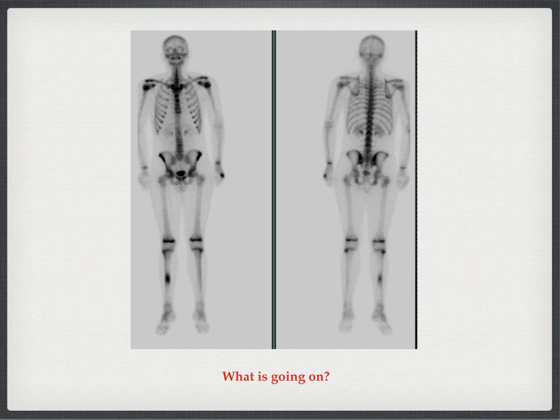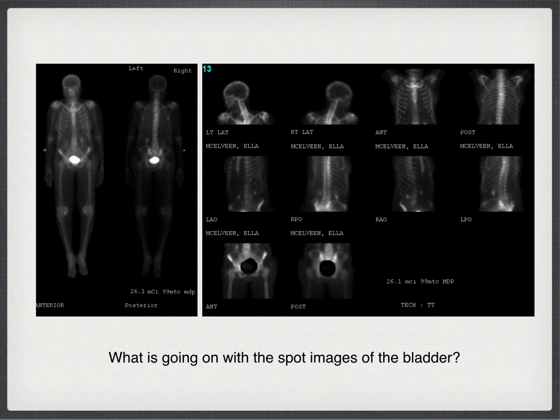And we can see focal increased uptake in the right tibia. In ideal circumstances, this needs to be done with MRI, not a bone scan, to avoid radiating the poor child. But in the past, this used to be pretty common, so this is probably a tibial stress fracture.